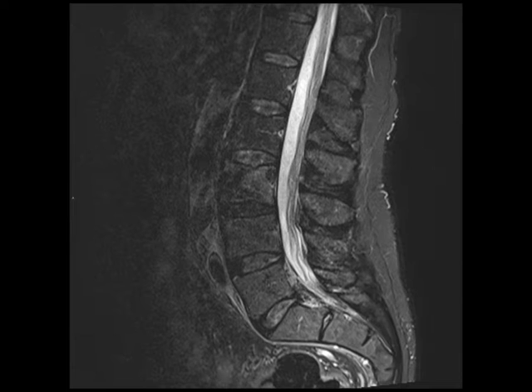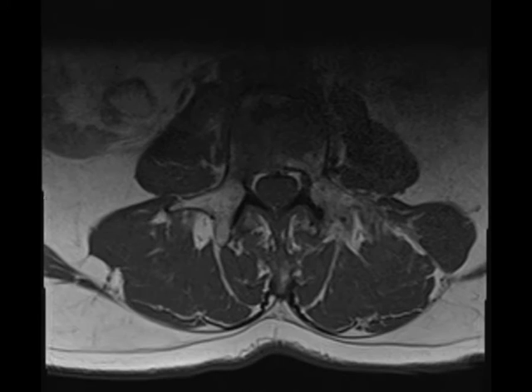levels. These imaging findings are most compatible with osseous metastatic disease with secondary extension into the adjacent soft tissues at the L3 vertebral level. No pathologic fracture was identified on this examination. On a few of the images, there was extension of metastatic disease into the ventral epidural space without significant compromise of the spinal canal diameter or adjacent neural foramen.